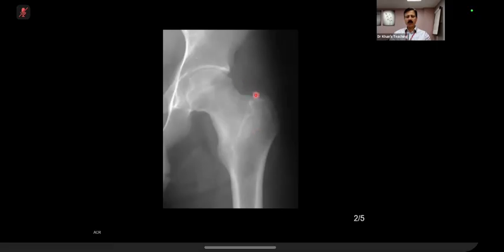Anything you can see here? Stretch of imagination. You are in osteoid osteoma. So there looks like, is there some soft tissue or like disruption of the fat planes around that? Okay, so you have picked up effusion. Well done. Well done.